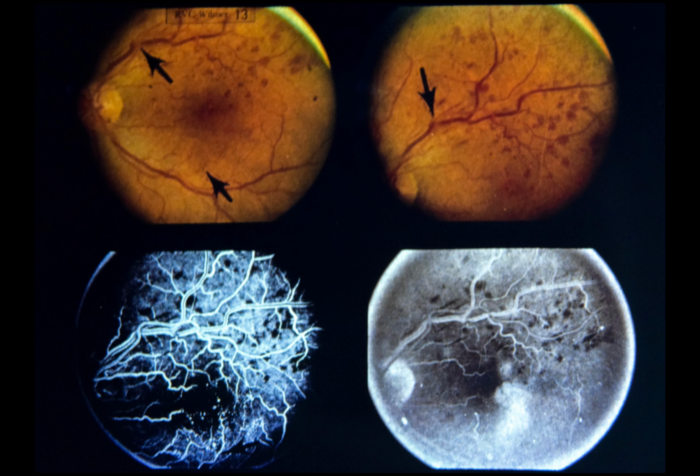Small arrow points to occluded inferior macular branch vein unrelated to the supratemporal branch vein occlusion above. Lower right, 10 minutes after dye injection, note cystoid maculopathy secondary to inferior macular branch vein occlusion. Staining of vessel walls above is also seen. No treatment was recommended at this time.